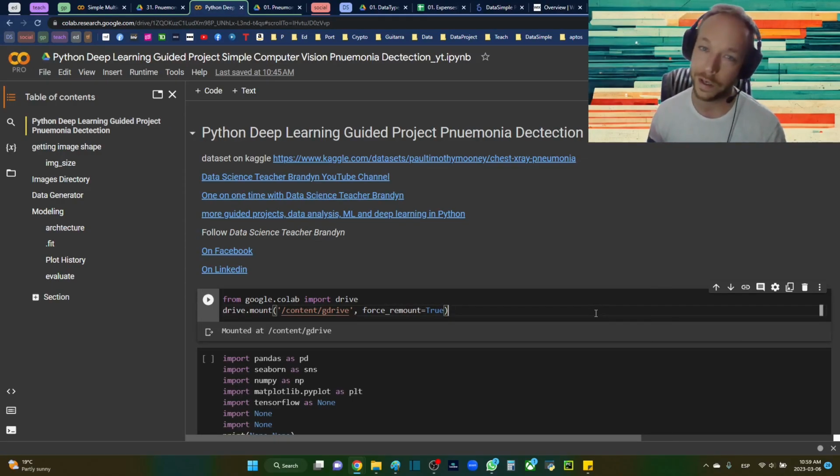You're here with data science teacher Brandon, and we're going to do a deep learning computer vision project for a pneumonia detection problem. So, binary classification: do they have pneumonia or not? Okay, awesome.